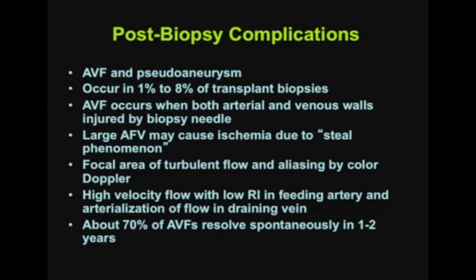By ultrasound, we will see a focal area of turbulent flow and aliasing with color Doppler, and there will be very high velocity flow with low resistance in the feeding artery and arterialization of flow in the draining vein. Interestingly, the majority of these fistulas will resolve spontaneously in about 1 to 2 years' time.